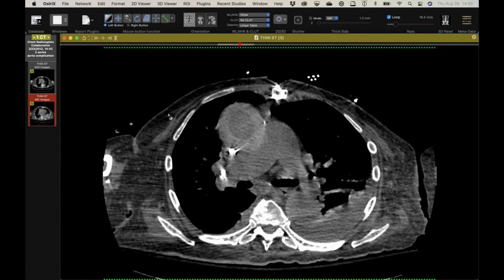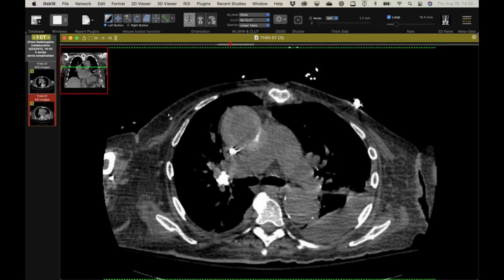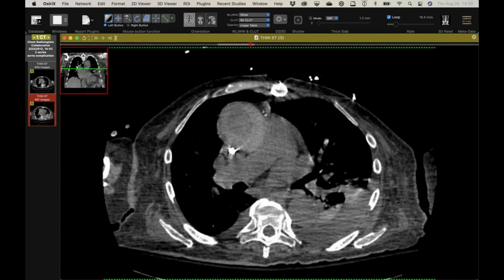Yeah. But when I called them, they're like, "Oh, he feels fine. His hematocrit's stable. He's been walking, and the only reason he's in the hospital is he's close to discharge." On that slice, the mediastinum doesn't look too inflamed, right? No, that's the thing. It's so clean that it almost looks like it's contained by something. Yeah.